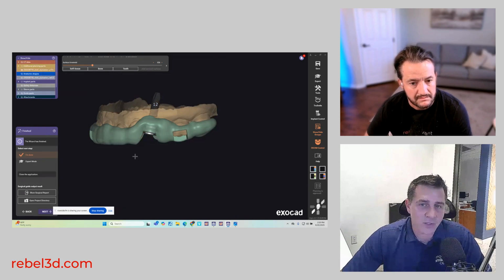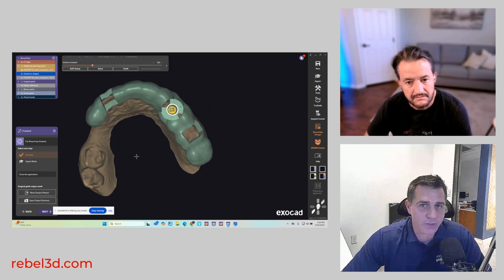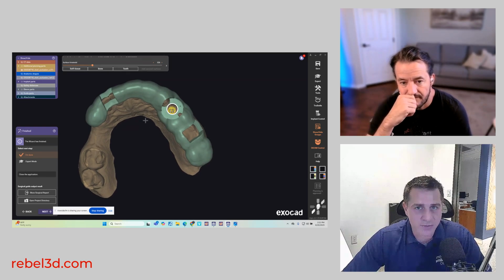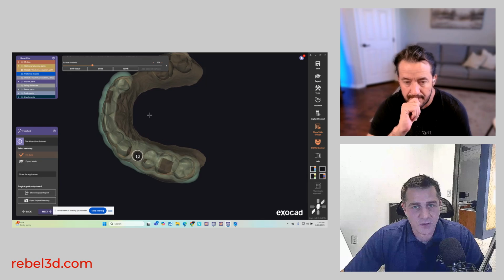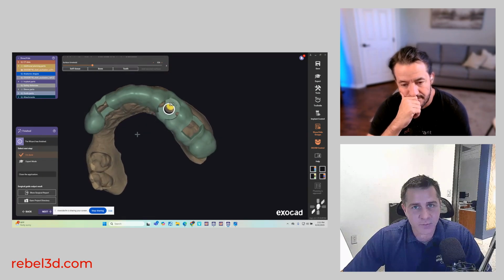And how long did it take me the first time I did this? I played around with it quite a bit, tried to get familiar with all of the parts and everything, but it probably took me an hour the first time, and then the second time, now that I was more familiar with it, maybe 30 minutes, depending on the challenging parts of the case. But I think the more you do it, you could probably plan a case in 15 minutes or less and have a guide ready to go.